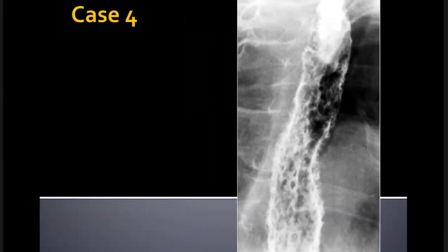I'm presented with a spot image of a barium swallow double contrast study in which I'm able to appreciate that there appear to be multiple nodular filling defects, giving a lace-like pattern, and linear ulcerations within the mucosa of the esophagus with surrounding irregularity of the wall, suggestive of shaggy esophagus. So based on these findings, my provisional diagnosis is likely Candida esophagitis. Differential includes glycogen acanthosis. Further, I would go for endoscopic brushing to confirm my findings and correlate with the history of diabetes.